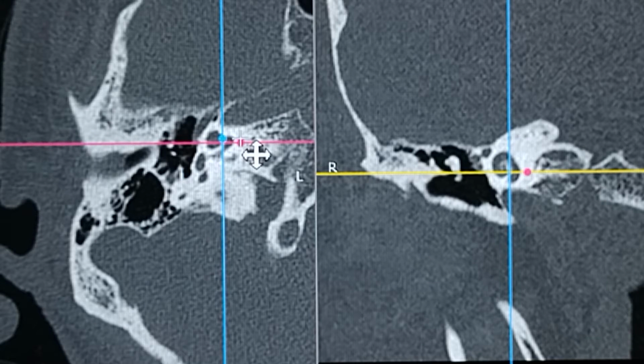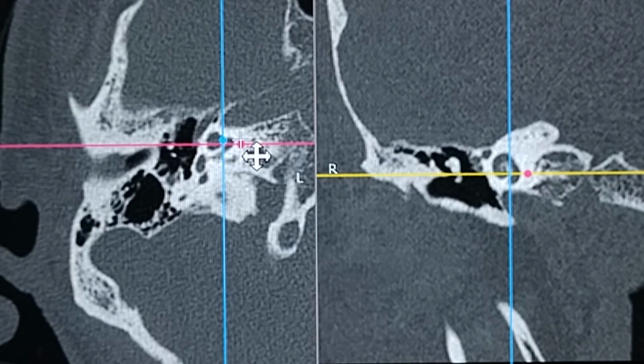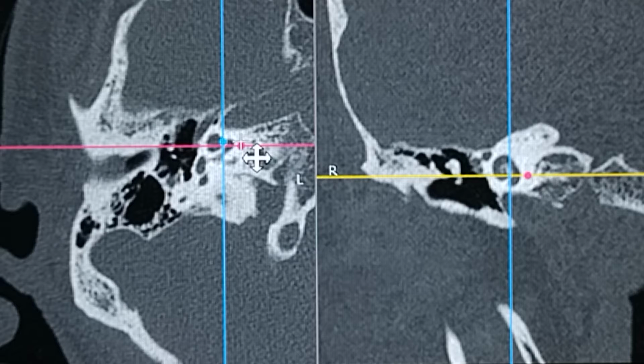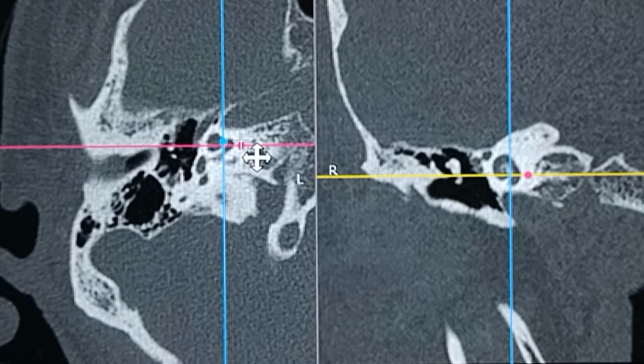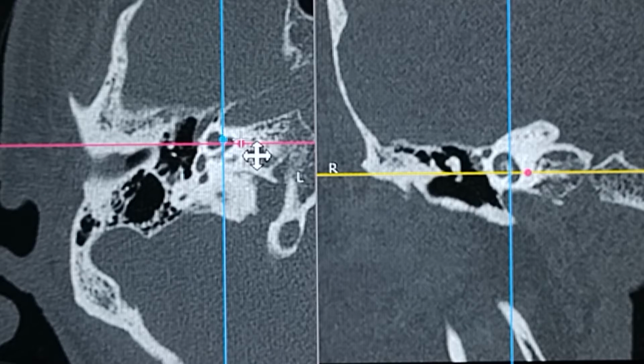Now this patient has a normal cochlea. Now the clinical significance is that in a lot of patients who are young, 3 years, 5 years, or very young, they have congenital deafness. A lot of cochlear anatomic deformities are there: Michel's deformity, Mondini's deformity, then IP1, IP2, IP3. IP stands for incomplete partition deformity. There are 3 types. I'll show you how they appear a bit later on.